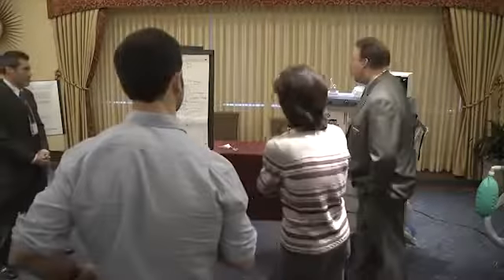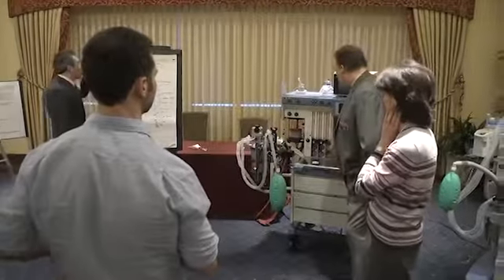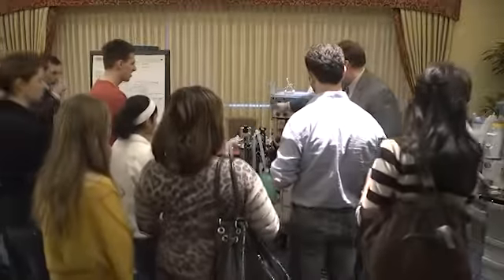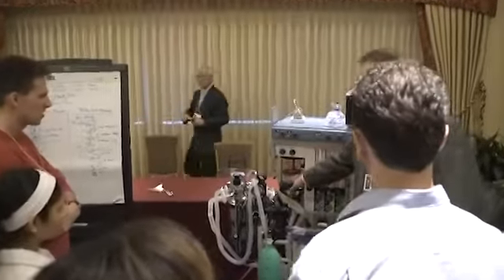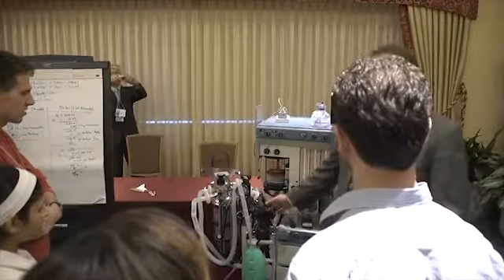So what we can show you is, this is a Narkomed GS anesthesia machine. Feel free to come closer so you can have a better look at it. When I turn on a liter of flow on this machine, I've got a frequency of 10, I:E of 1 to 2. My inspiratory flow is high enough to deliver the volume that I've got set in. When I select the selector valve over to auto mode, my breathing bag is now out of the system. Okay, and now my ventilator will start, and I've got about 600 set for a tidal volume.